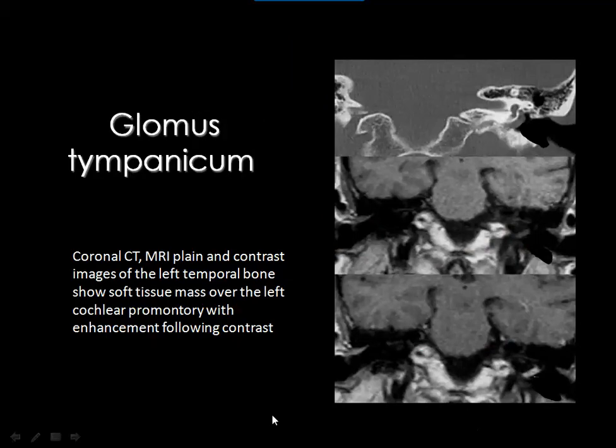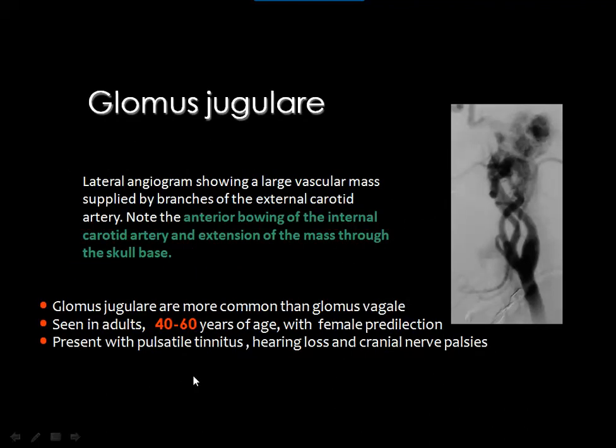And here you see a lesion on the left side, by CT scan and by MRI T1 weighted image, and after contrast you get a strong enhancement of the lesion. Then you are dealing with the glomus tympanicum, not a cholesteatoma, because you remember that cholesteatoma does not enhance with contrast.